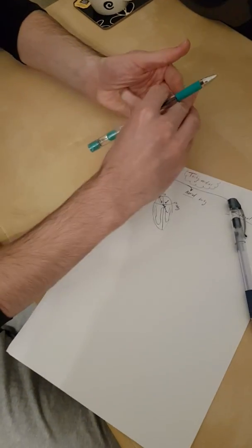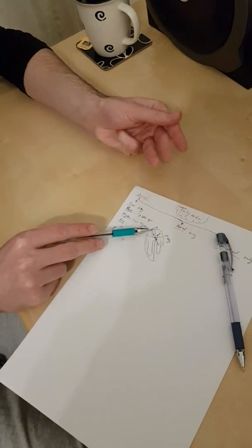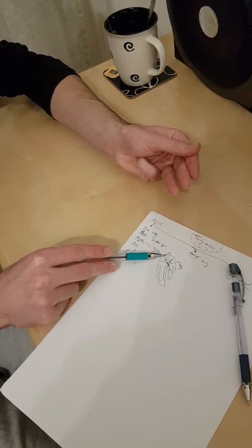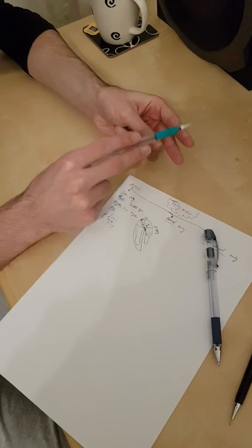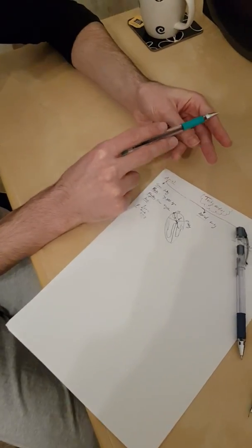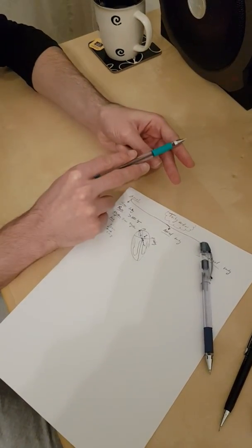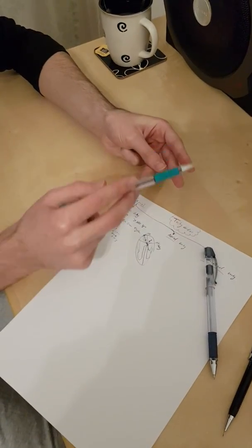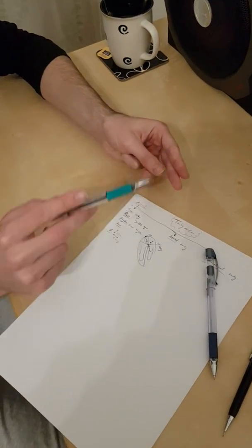Then we checked for 3 things together to determine that it's a sinus. There is a P wave before every QRS, meaning it's initiating normally from the right place. So P wave before every QRS, and every QRS has a P. Because if we see a P without QRS, it means the P got blocked. Or, for example, if we see a QRS without a P, it means that this QRS came from somewhere without a P. So that's why we need here this PQRS, PQRS.